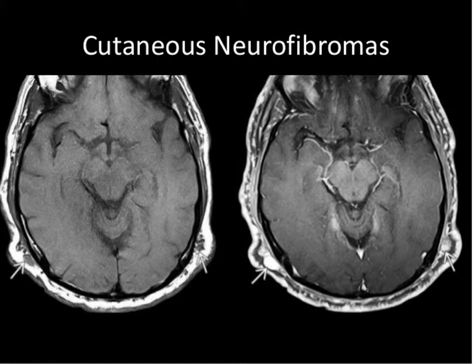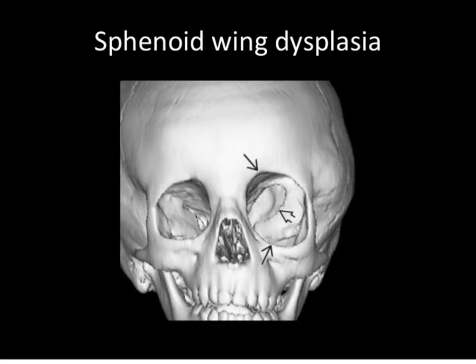This image shows multiple neurofibromas, solitary but multifocal. You can see in the skin there are nodules, multiple in the skull, bilateral. Also, sphenoid wing dysplasia is not pathognomonic, but if present, it is characteristic of neurofibromatosis. What's the sign here? Bare orbit sign. We presented it, I think, last week. Yes, absence of the line, the bare orbit sign.